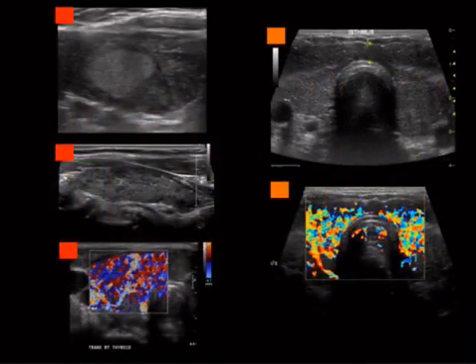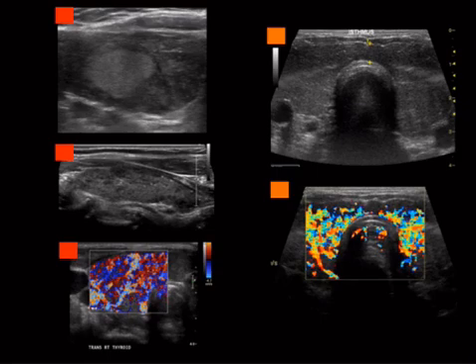All right, so here's two ultrasound cases, this versus that, and I'll point out that, so some gamesmanship here. Let's start with the orange one. Notice there are calipers on the isthmus. Anytime there's calipers on anything, it's either too big or too small. You don't necessarily have to remember numbers. If they threw calipers on it, you know it's too big or too small. But in this case, it's too big because you can just tell it looks fat.